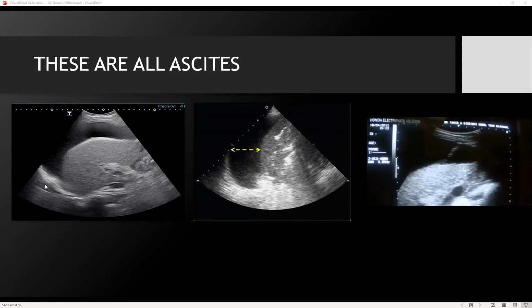In all these cases, you can tell that this is not a pleural effusion. For example, first of all, look at the liver. You don't have this sort of thick outline that you often have down here. You're starting to see it, but you don't see any thick diaphragm like you're seeing over here that's usually overlying the liver. The other thing you're not finding is, if you're going to tell me this is the liver overlying the diaphragm, where is your costophrenic angle? Follow this down, and eventually you're seeing bowel and small intestines. If you can't find a costophrenic angle, then you didn't find the diaphragm.